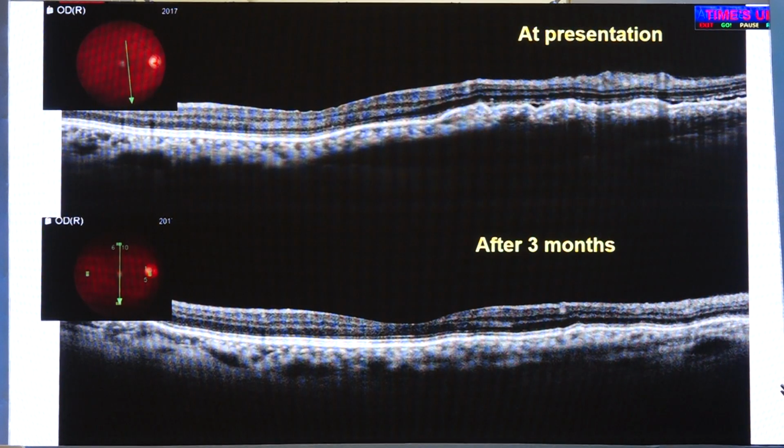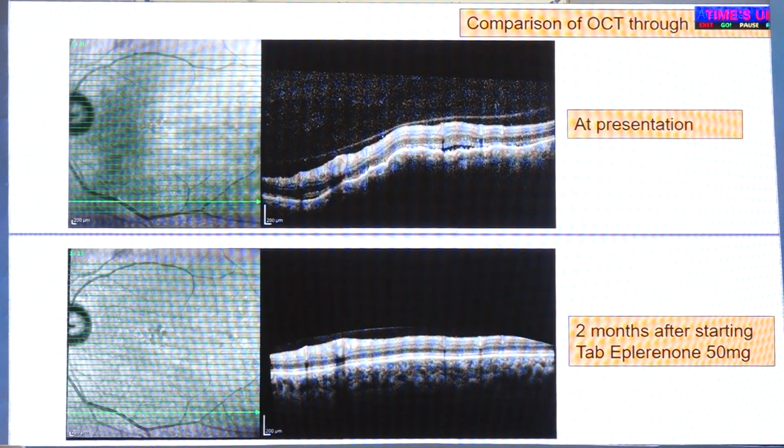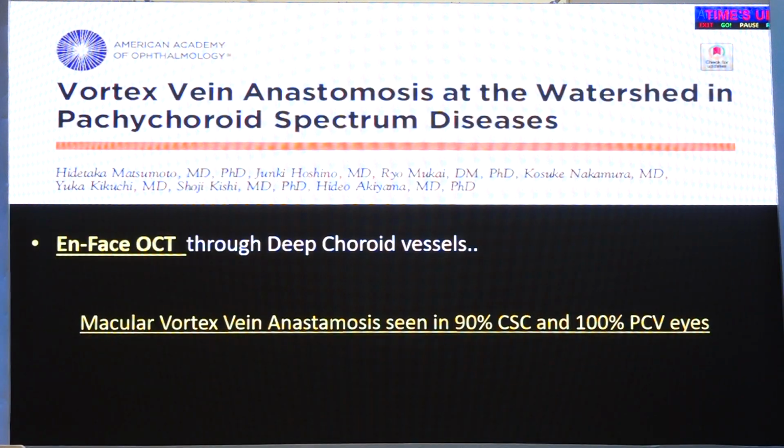Another patient, again posterior choroidal loculation of fluid, and you can see a lumpy, bumpy choroidal elevation like a metastasis, choroidal metastasis. But then with eplerenone, this patient's choroidal loculation has disappeared, mimicking a posterior choroidal mass lesion. It's a rare finding or biomarker in CSC.